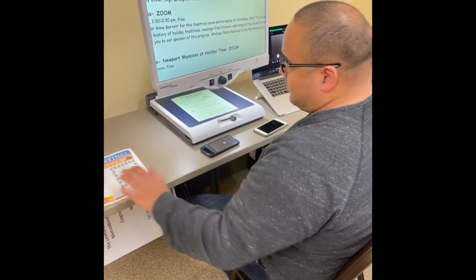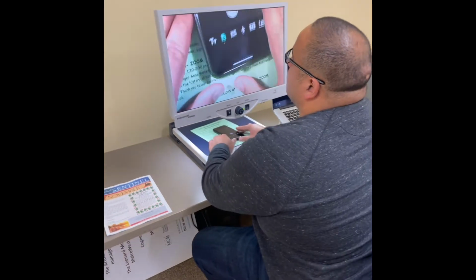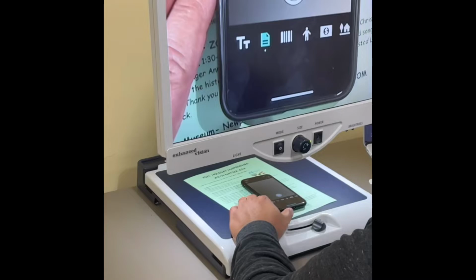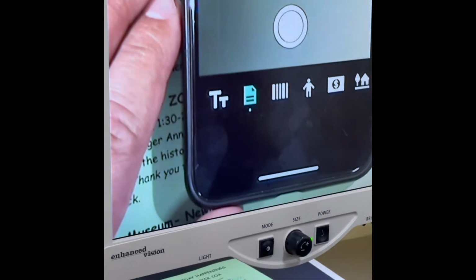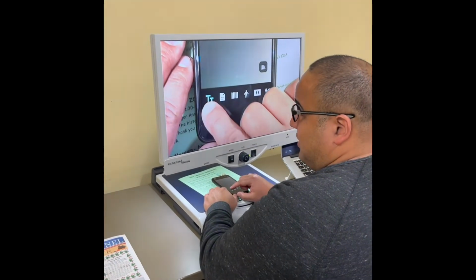And that's the short text, which looks like this. Short text is this feature here, which is the first button, first tab, or the way that they have it called, a channel. I'll call it a tab. So that's the short text tab.